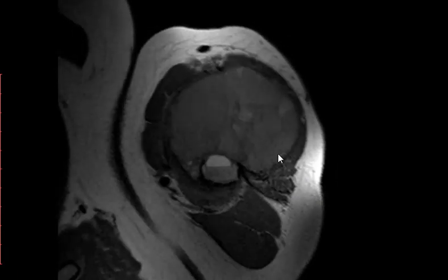And you can see the cortex of the humerus is what? Where is the cortex of the humerus here? Don't move. Where is the cortex here? This is the hypointense part, the cortex. Okay? And you can see it is here what? Lost. Gone. And you can see the lesion starting in the medullary cavity of the bone and going through here to the surrounding soft tissue.